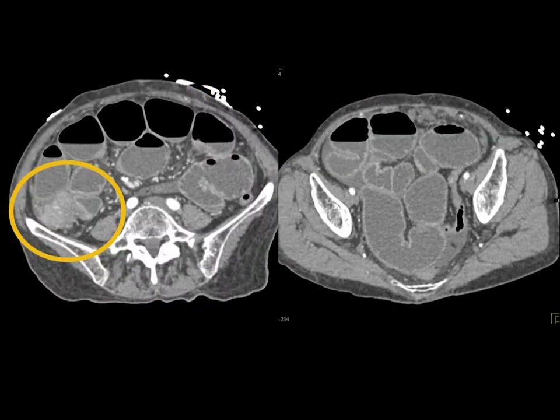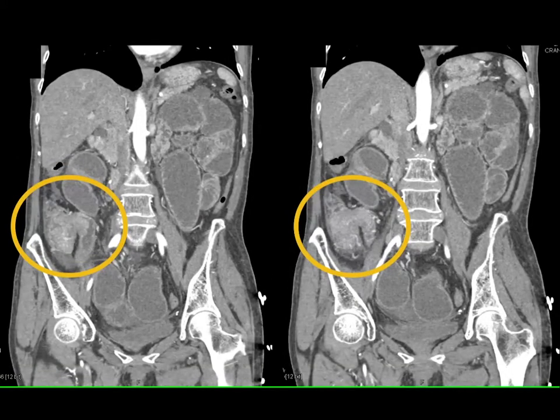We followed the small bowel downward, and we noticed that in the right lower quadrant by the terminal ileum there's a soft tissue mass. When you look at the coronal view, that soft tissue mass is going into the cecum, or one could argue there's a cecal mass going into the ileum. But nevertheless, what do you think about? You could say, well, maybe this is a carcinoma of the cecum growing into the ileum. That doesn't happen all that commonly.